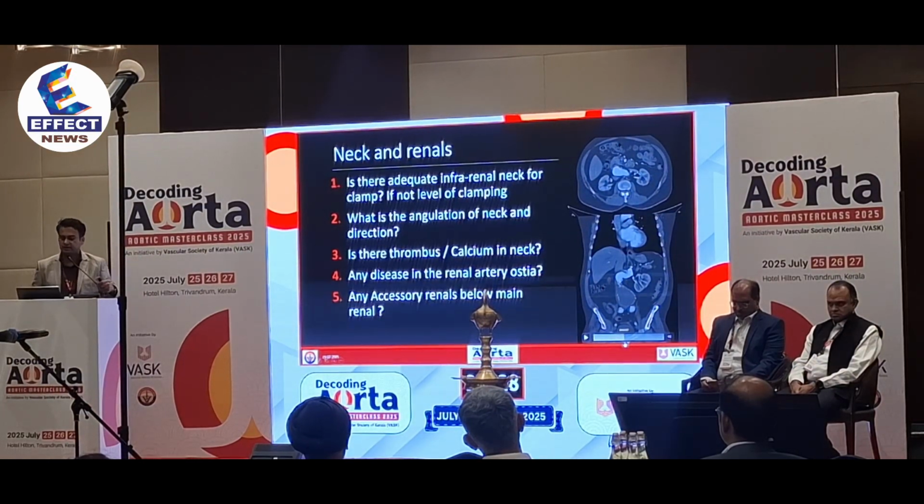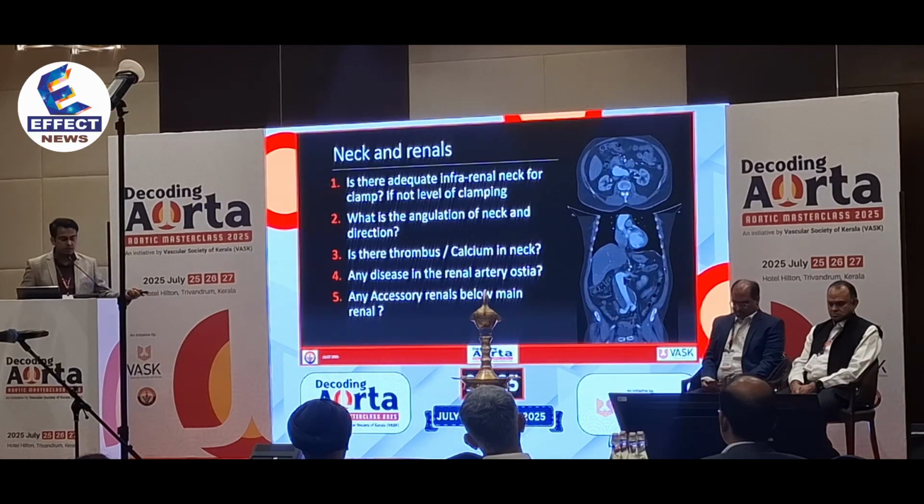So all these things should come to your mind when you look at the CT. One more thing that you can pick up is an accessory renal artery on the left side.